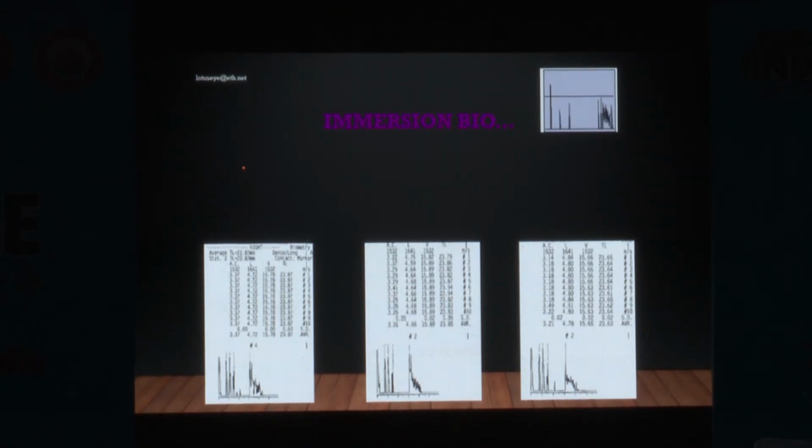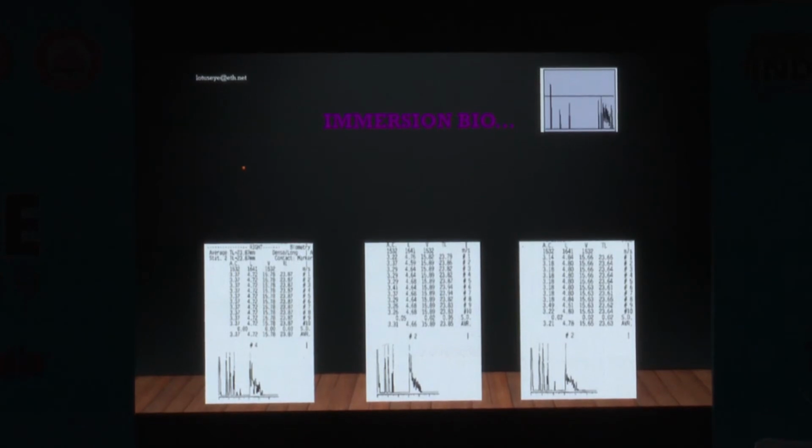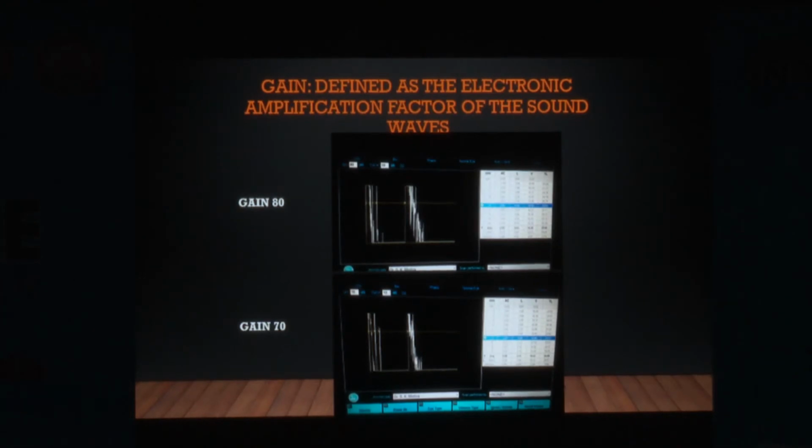Now how will you say what has gone wrong with this third scan? If you look closely at the various spikes, you get them from the cornea, then anterior lens, posterior lens capsule, retinal spike, and sclera and orbital pad of fat. It is present. Here, if you see, after the retina spike there is no scleral spike. This will happen if your probe is focused towards the optic nerve head. So paying attention to the details of the scan quality, you can have some idea.